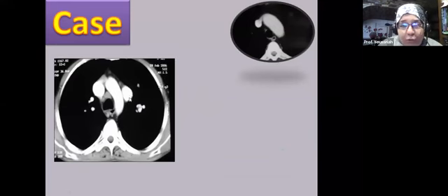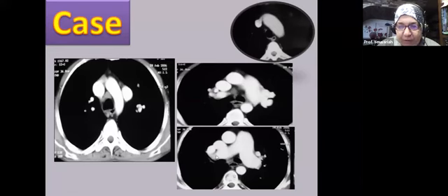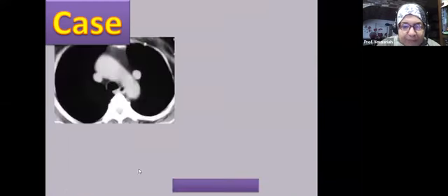What we do is follow this vascular structure up and down to see where it comes from and where it goes. When we follow this structure downward, we found that it's actually a dilated pulmonary artery in a patient with pulmonary hypertension and mitral valve disease. So it is only a big pulmonary artery that has ascended to a higher level in cuts. Another case with the same finding.